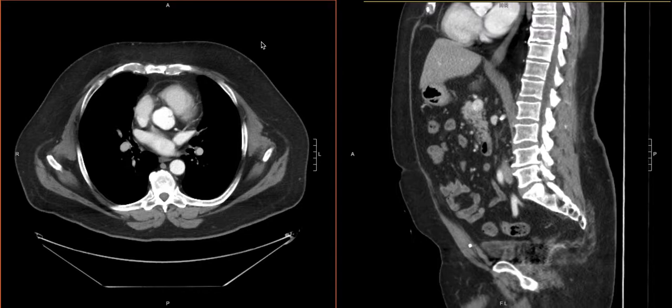There's a lot of different ways to do a search pattern. This is just one example, but when you're ready to start looking at the subcutaneous tissues, I think it's very important to make sure that you're windowed appropriately. There are soft tissue windows that some systems have, or some soft tissue presets. I use the abdominal window to look at the soft tissues. I think it works pretty well.